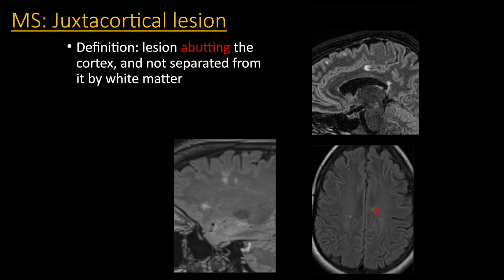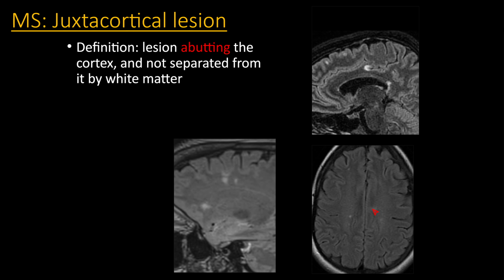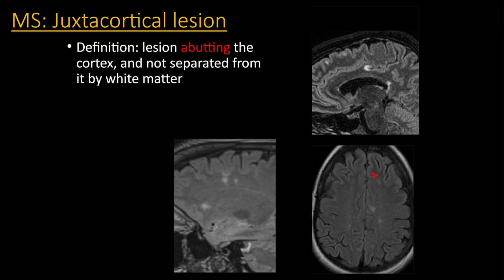And then this lesion, you see on axial. If you have traditional FLAIR, it's much harder to say that it's a juxtacortical lesion because the cortex is not very well defined on these thick section images. But on these thin section volumetric images, you can nicely see at multiple slices that it's hugging along that cortex, and it's a clear juxtacortical lesion.